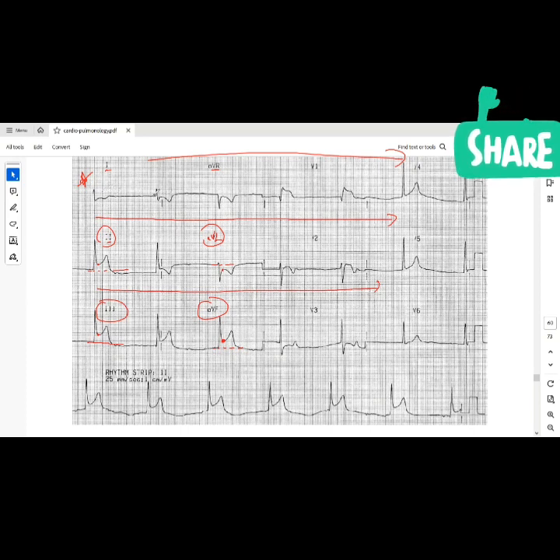So as I go through, I remember the elevation has to be significant, otherwise we don't really care much. And definitely significant for 2. AVL has some depression. I'm going to tell you why that's important soon. And then 2, 3. Now, out of the leads that have abnormality, let's say we identified maybe 3 or 4 types of abnormality here.